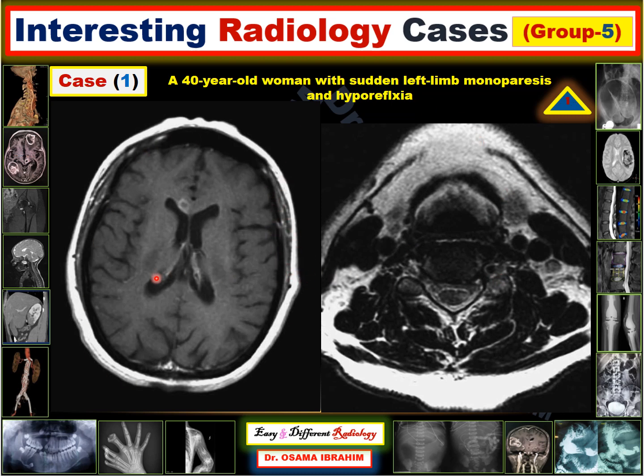This is our MRI images, and in the MRI the bone appeared dark like this. This is the calvarial bone, and subcutaneous fat appeared bright. So this is white matter, which is also white. So this is a T1 weighted image.